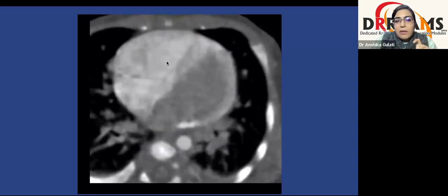By D topology, we mean that the right ventricle is on the right side, and we see the moderator band also, and the left ventricle is on the left side. So RA on right, RV on right, there is AV concordance. LA on left, LV on left, AV concordance again. Then the next step was VA relation, that is ventriculo-arterial relations.